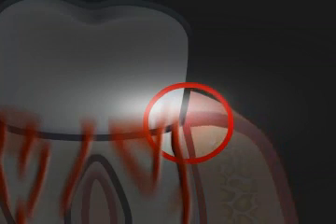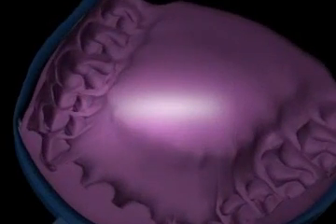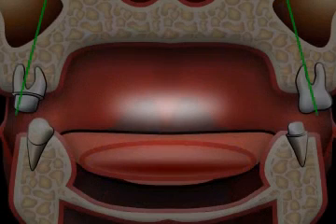This kind of mistake can be avoided by laying threads prior to the execution of the impression and preparation. More about that in the video entitled Dental Impression. Of course, the impression material may become deformed. This can happen primarily if the material has exceeded its shelf life, if the processing times are not observed, or if, as shown in the animation, the impression material is handled incorrectly.